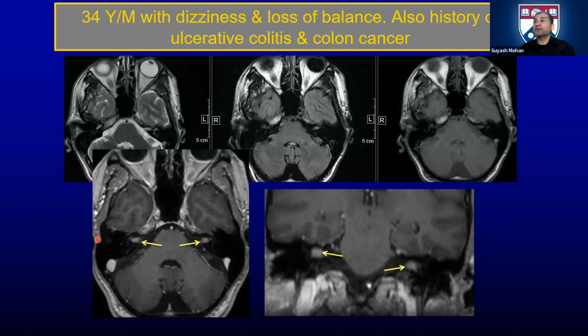This is the very first place where you can have leptomeningeal enhancement and carcinomatous meningitis, right? So that becomes life's lesson number 4 or 5.